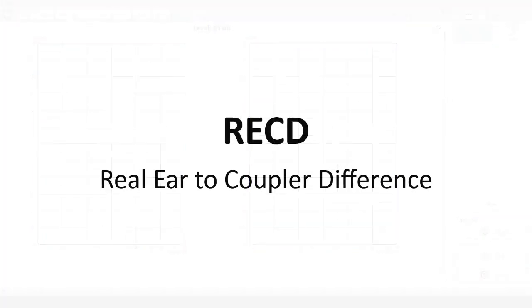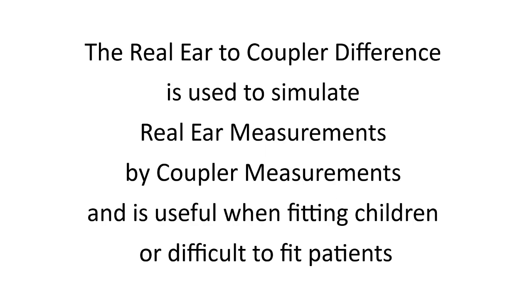RECD, RealEar to coupler difference. The RealEar to coupler difference is used to simulate RealEar measurements by coupler measurements and is useful when fitting children or difficult to fit patients.